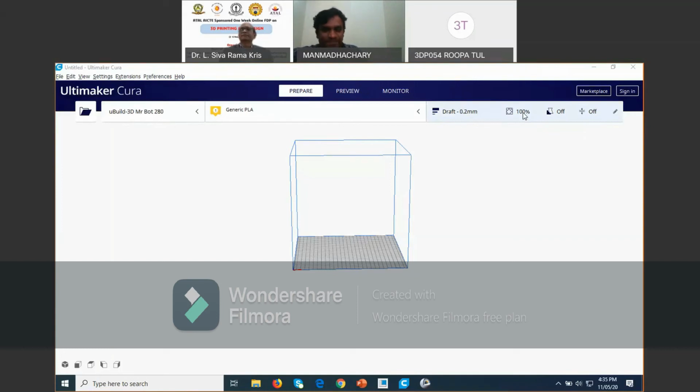So for the missing parts of the skull, again, you have to use repair algorithms and software like Meshmixer and Materialise. I explained in the beginning in my biomedical modeling that you have to use different software for getting the final part before you print it.